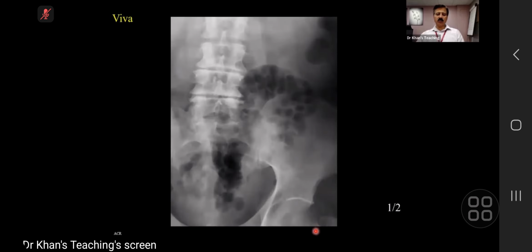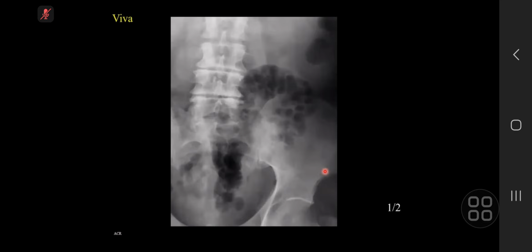Okay, this is the Aunt Minnie case which I was talking about. Over to you. Okay, this is a coned-in abdominal radiograph. There's a dilated loop of bowel with multiple locules of gas within the bowel lumen. And there's some locules of gas also near the inferior portion of the film that seem to be just projecting from the bowel wall.